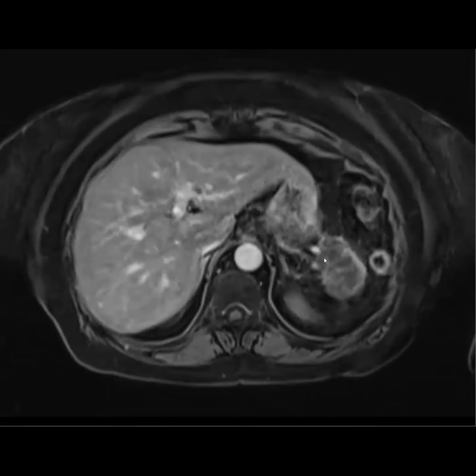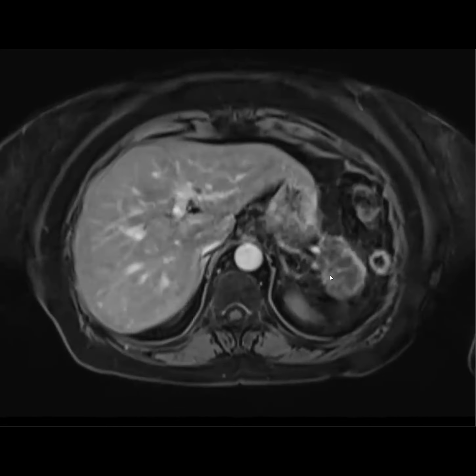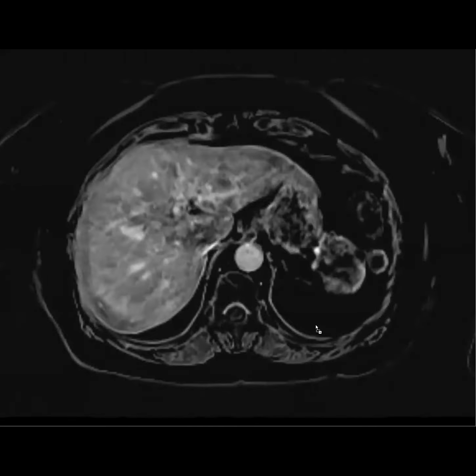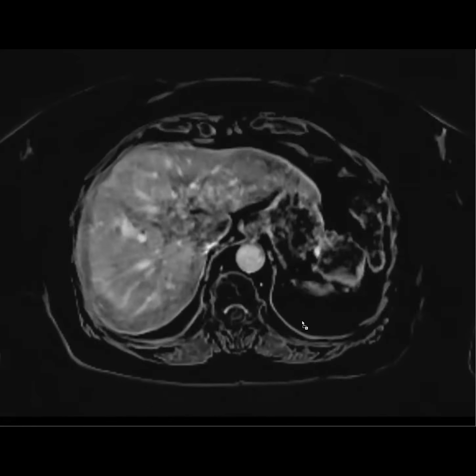So this is what it looked like post-contrast. I would say it can even be tricky post-contrast because it has so many septations that it can look enhancing. You can see a lot of these septations are enhancing. I'll show you the subs. So I don't think the post-contrast really helps on MR and definitely not on CT. But I think what clinches it for me is the T2.